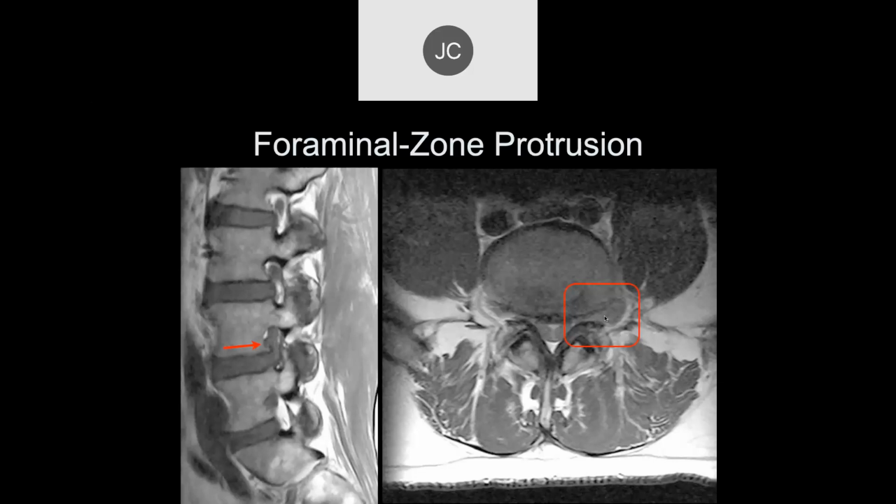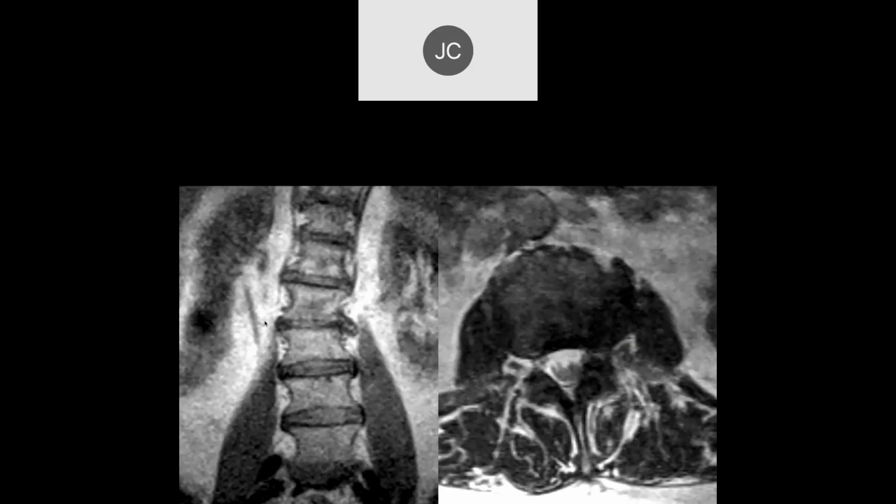We don't really have any great big studies correlating surgical and MR findings with basic patient symptoms or outcomes. It's unfortunate that we don't. But of the smaller studies that we have, the one finding that seems to be reliable is that acute foraminal zone protrusions do produce radiculopathy due to compression of the nerve. And that's what we're seeing in this particular patient.